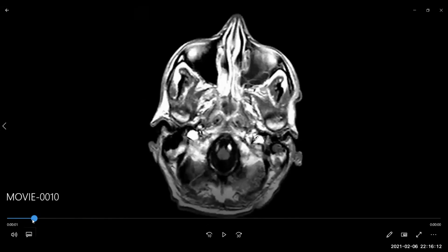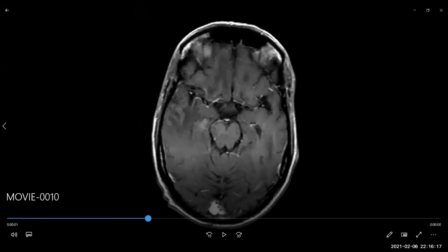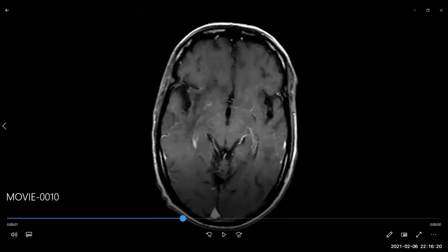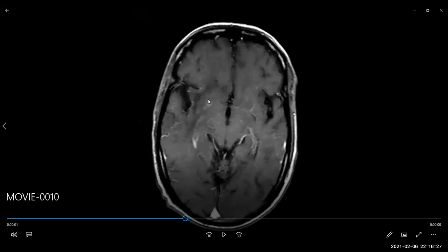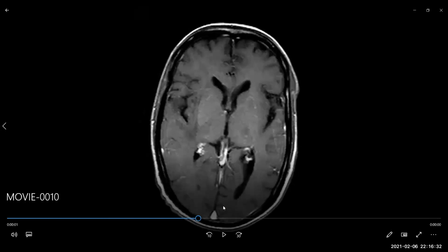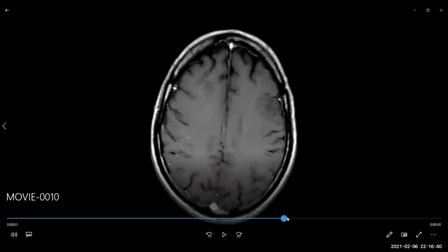In this case, you were right that there is a vasogenic edema. Actually, it is not involving the cortex, and gray white matter differentiation is well maintained. On the zoom or in the screen, it's not much evident, but there are multiple tiny punctate foci of enhancement over here in this region, asymmetric as compared to the contralateral side, as well as where the edema is there on the T2. So this was a case of secondary CNS lymphoma, with tiny lymphomatous deposits over there.